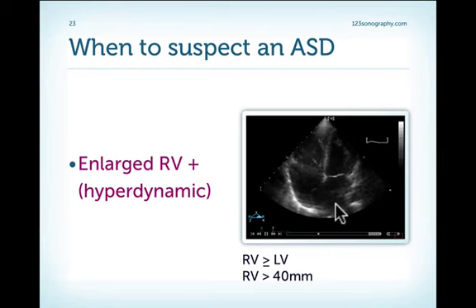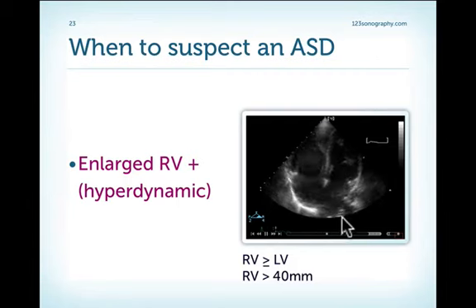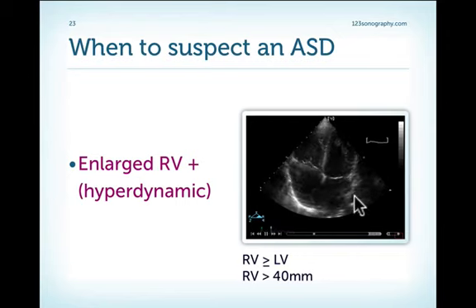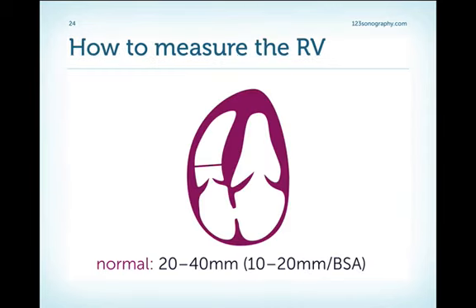Of course, this can also be tricuspid regurgitation or pulmonary valve regurgitation, but they are less common as primary disease, and we will always carefully look for atrial septal defects. If we cannot find a primum or secundum defect by TTE, the next step will always be a TEE to look for a sinus venosus defect.